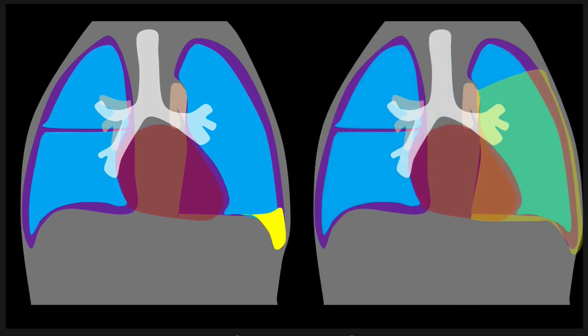So as a quick refresher here, that's upright and that's going to be supine. And like I said, the denser the white appearance on the supine, the more volume of fluid that you probably have.